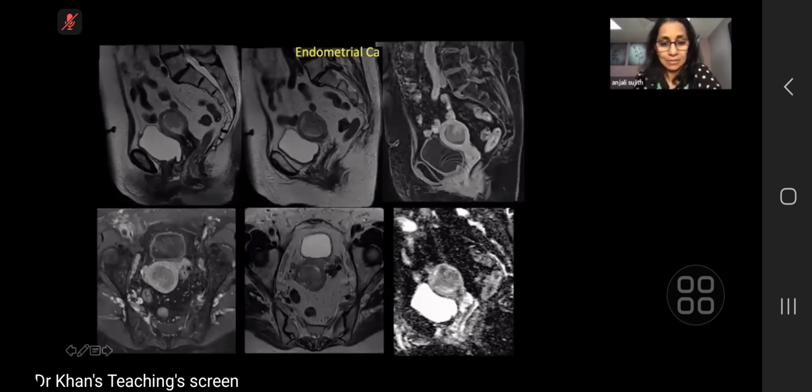In the available axial images, you can see a few lymph nodes there. The lymph node criteria are, one, dimensions: these were subcentimetric in short axis. The second is morphological appearance. Even if they are subcentimetric, if they look round with areas of necrosis, then you would consider them as positive lymph node involvement. In this case, they do not fulfill the criteria, so they were not highly suspicious. If the lymph nodes were found to be positive, then the staging goes up to stage 3.